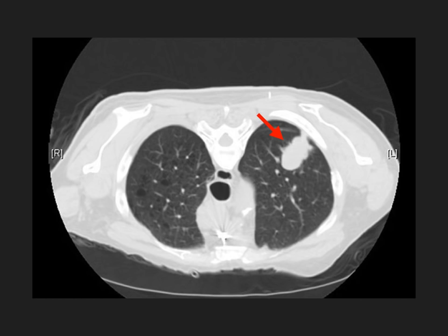When you're looking at an image of the heart, ask yourself, do I see all 4 chambers? Does anything look abnormal here? When you're looking at the lung fields, start on the periphery and look for masses and then work your way towards the center. And when you're in the brain, always start looking at the lateral ventricles, any ventricle, especially the lateral ventricles, because ventricular enlargement is very high yield and they will tend to show you hydrocephalus.